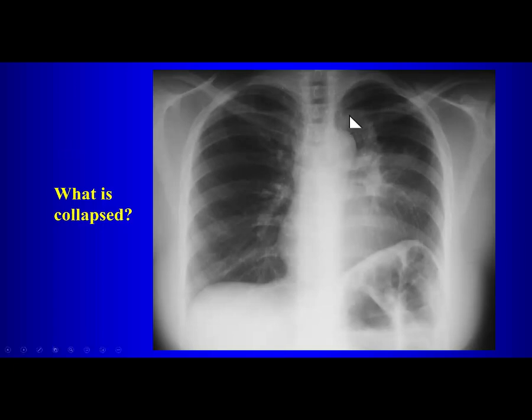So you think that there's a lucency here, okay, which might be a luftsichel sign, right? What else is abnormal on the chest radiograph? There's heart shift toward the left. Heart may be shifted towards the left. What about the heart, though? What is it about the heart that's important to notice? Obscuration of the left heart border. Yeah, the left heart border is obscured. You don't see the left heart border, right?